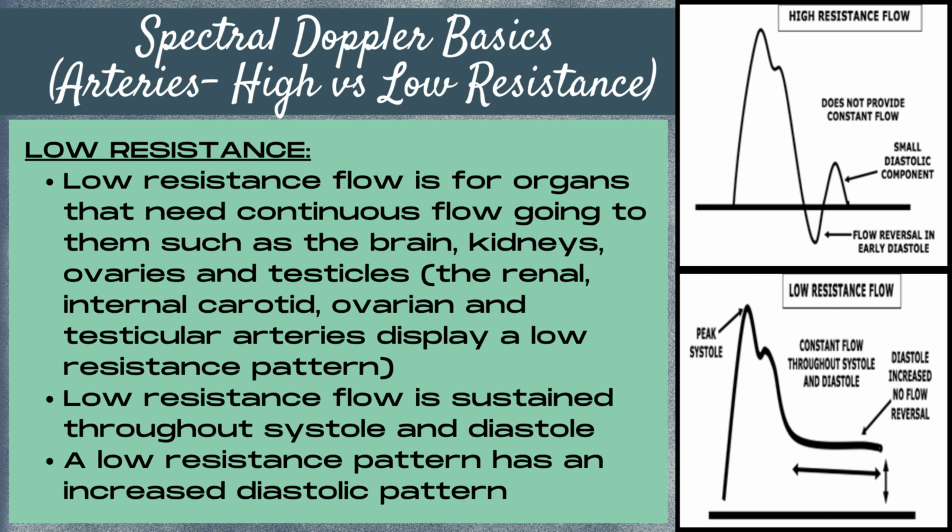And these are arteries such as the renal, internal carotid, ovarian, and testicular arteries. And these all display low resistance patterns of flow. And low resistance flow is flow that is sustained throughout both systole and diastole. And a low resistance pattern is going to have an increased amount of diastolic flow.